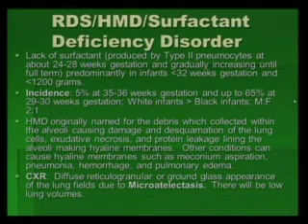The chest X-ray will show a diffuse reticular granular or little nodular pattern throughout the lung fields. They may have a ground glass appearance, and this is due to microatelectasis. The lung volumes will be low unless they're on CPAP or intubated. So initially the lung volumes are low.